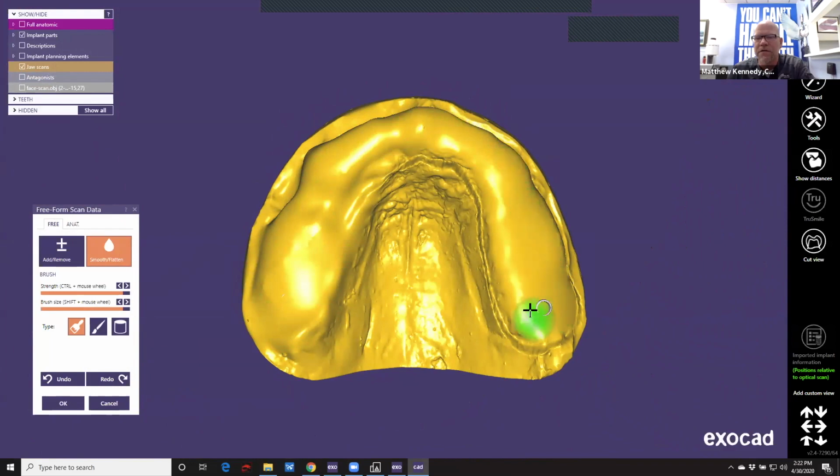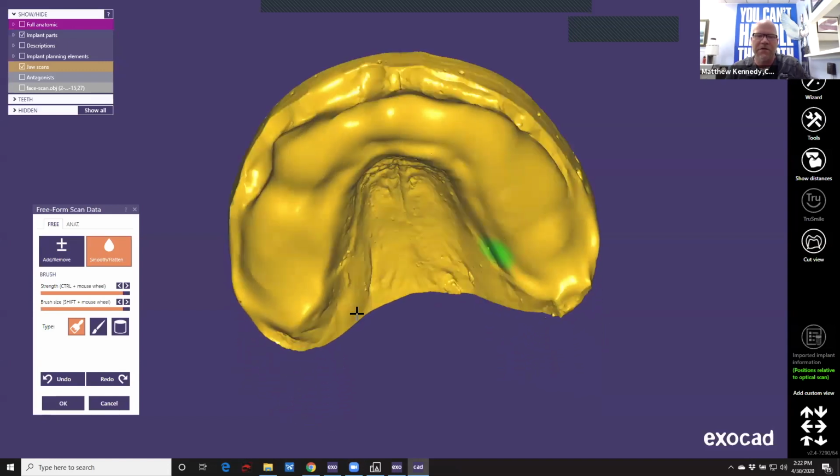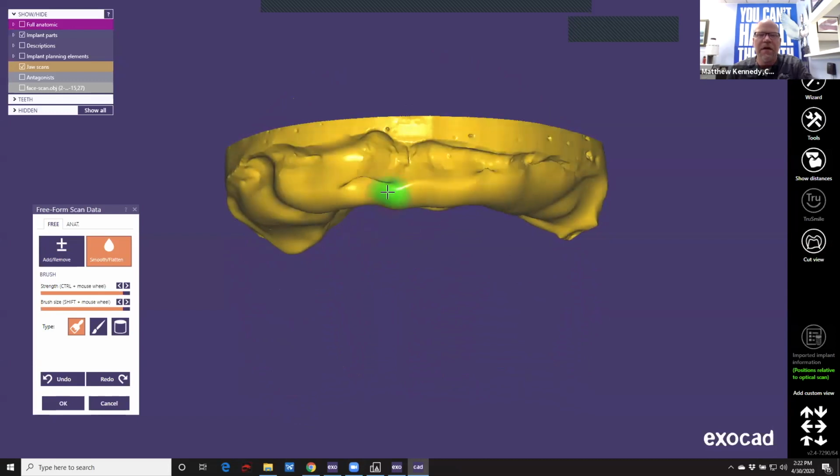Cruise right on. There's one of the tops of one of our implants. Okay. So we can add some here if we wanted, just so it looks a little prettier. All right. Again, because we're in a hurry, you can fine tune this however you want. Go over with your surgeon how much tissue you plan on removing. Everybody agree on something, and then design accordingly.